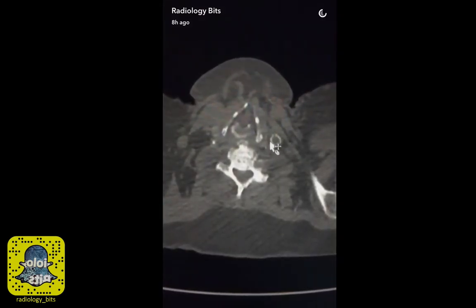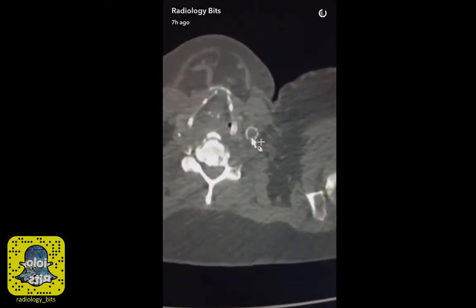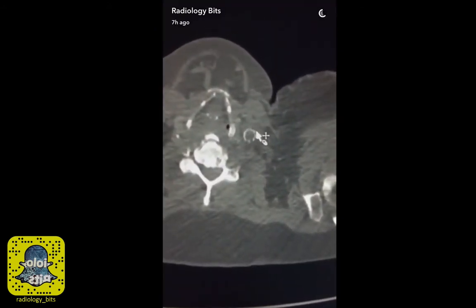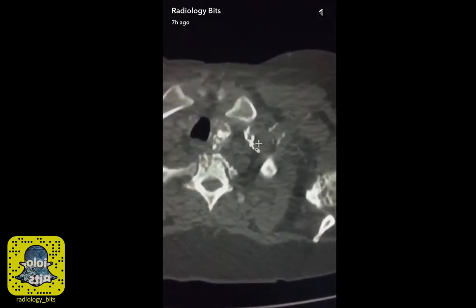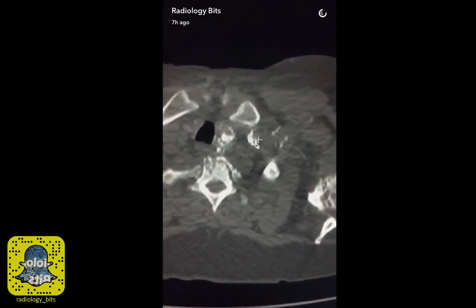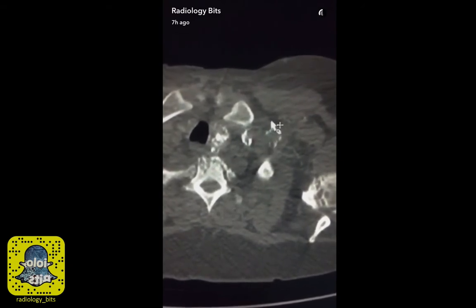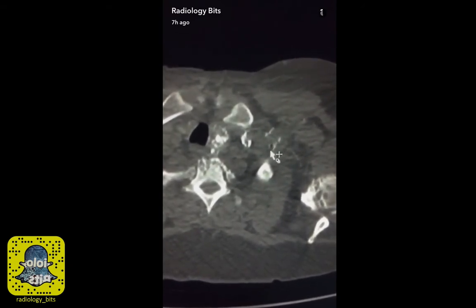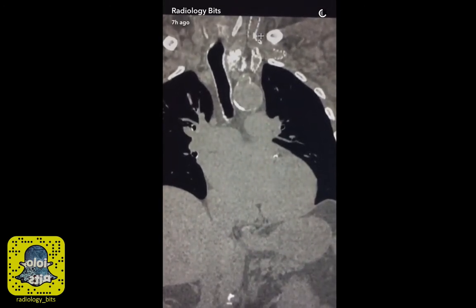What actually looks like calcific density is higher density and is metallic, circumferential, and well organized. Knowing our anatomy, you'll notice that this is involving the left internal jugular vein. There's another similar structure that involves the vein as well. And although difficult without intravenous contrast, knowing the anatomy, you'll also recognize that this here is involving the left subclavian vein. To appreciate those structures, let's look at this coronal image.